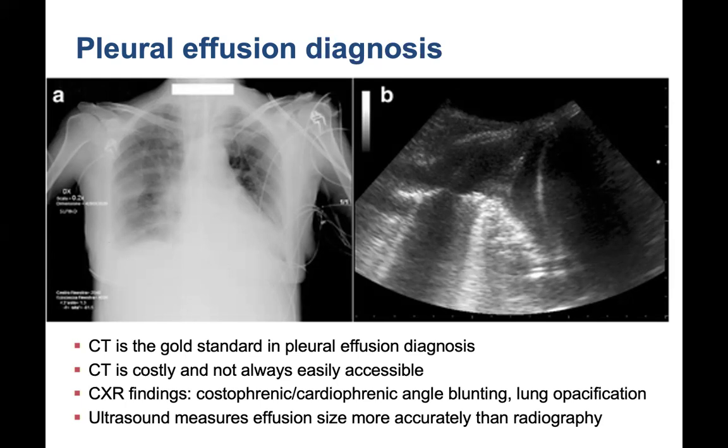In addition, I've seen many chest x-rays where the read says likely pleural effusion, and I go to ultrasound and there's not a very significant one. And I've also seen chest x-rays that show the opposite, where they say they look relatively clear, and then you take a look and there's actually quite a large pleural effusion.